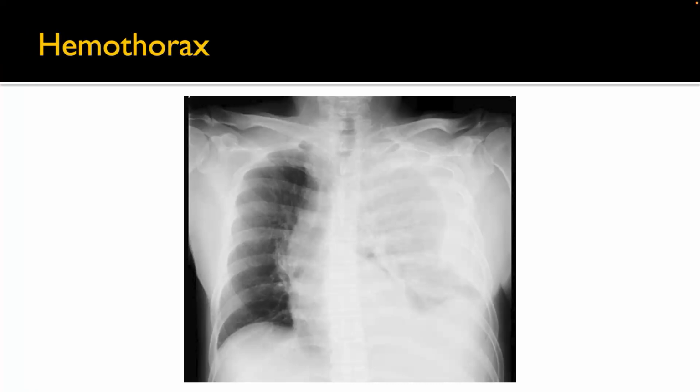Yep. This is where you get into the hemothorax. You see all that white. On a chest X-ray, if the patient is laying flat, that's going to diffuse out. It might be a little bit hard, if they're sitting upright, to tell the difference between an effusion versus a hemothorax. Of course, take everything into consideration. Is this a trauma? Something from that standpoint.